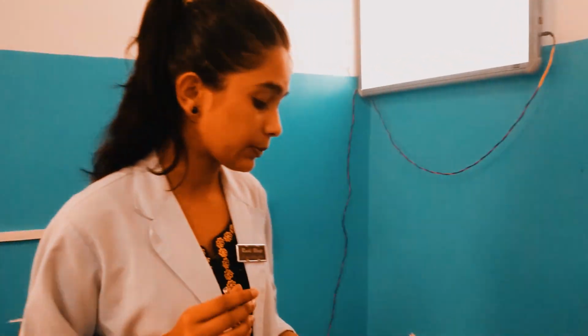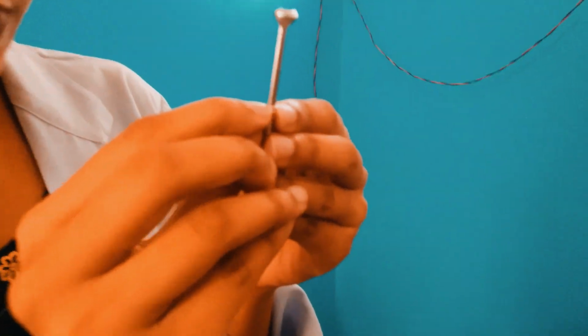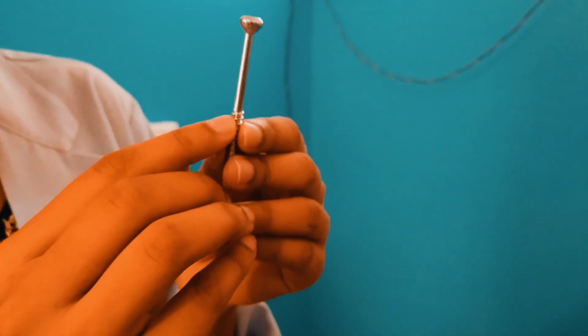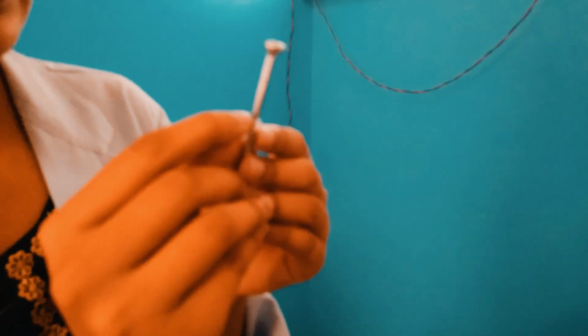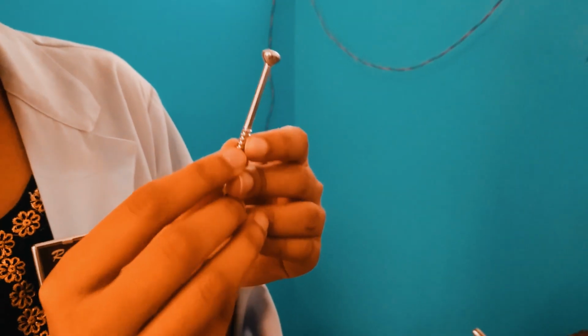Now we have a special type of screw, the cannulated cancellous screw. We don't have one here, but it has a cannula in between for the guide wire, and it is useful in closed reduction and percutaneous pinning. Now this point is an important component of the screw. This is known as the run out, the point where the shaft changes toward the thread. Here the diameter changes abruptly and there is a corner, so it is the site of maximum stress concentration and there is a possibility of breakage of the screw.